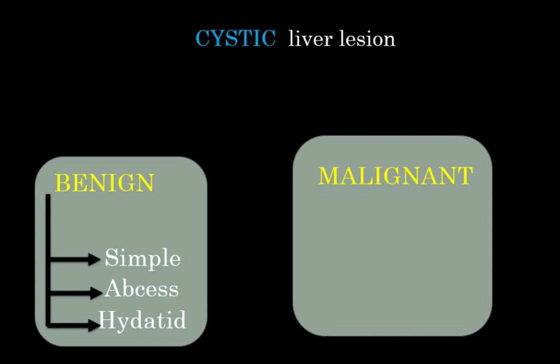Presence of a primary tumor, a patient known to have breast carcinoma, melanoma, colon cancer, or gastric carcinoma, is again in favor of metastasis. And the enhancement is mainly on the periphery, mostly in which phase? The enhancement starts at the arterial phase. So when you are suspecting metastasis, make sure to look carefully at the arterial phase.